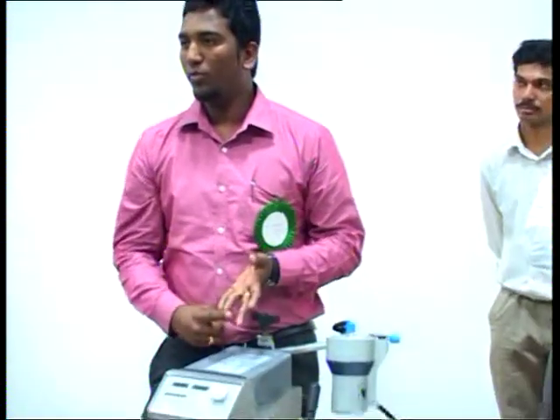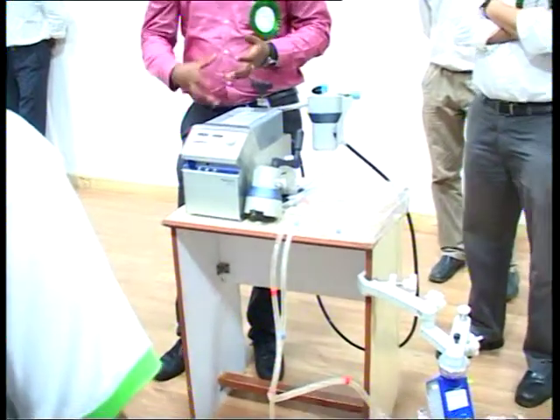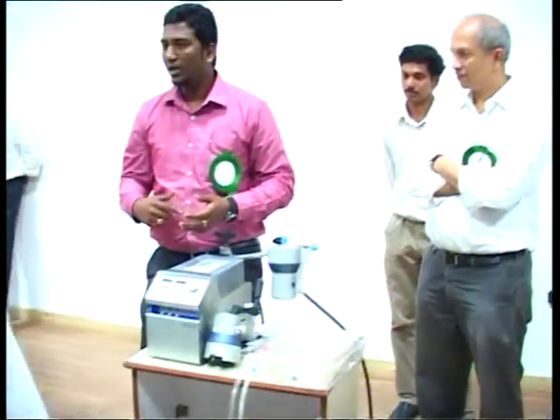The oxygenator, we pump it back to the patient again for longer duration. So cardiopulmonary bypass does it for shorter duration to keep the patient alive. But ECMO is nothing but extracorporeal membrane oxygenation. Don't get confused. It is an artificial circulation which is happening outside the body. The natural circulation is happening inside the body.